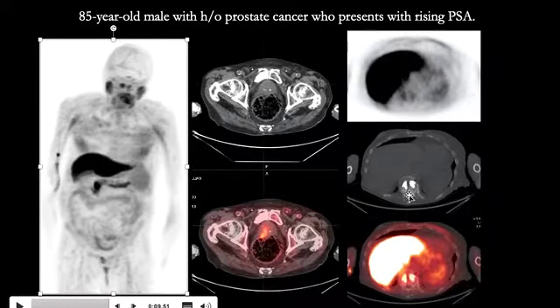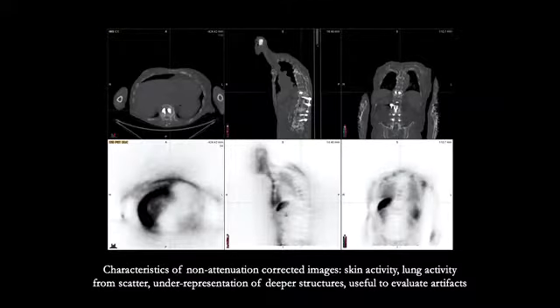These correspond to hyperdense vertebroplasty cement seen here on the fused axial PET-CT image. So is this finding real? Is there metastatic prostate cancer, or is this an artifact? Whenever we run into this situation, we evaluate the non-attenuation corrected images, and here we have the corresponding CT images in bone windows on the top and the non-attenuation corrected images at the bottom, showing no increased uptake and confirming that what we saw earlier was an attenuation correction artifact.